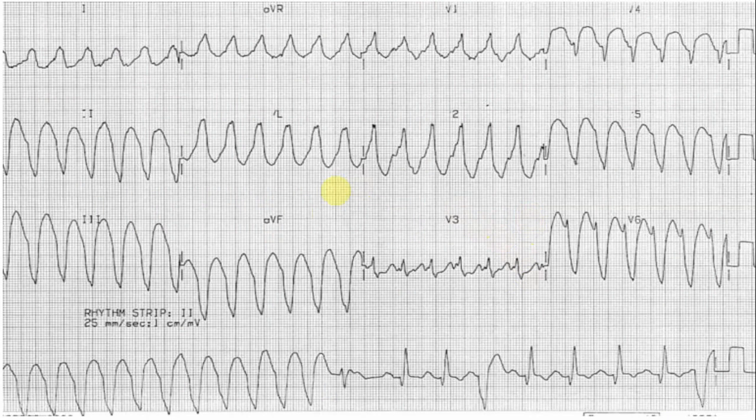Right, so let's have a look at another ECG. So this is another 12 lead ECG. We have got lead 1, 2, 3, aVR, aVL, aVF, V1 to V6, and also you have got a rhythm strip. So Becky is going to read this ECG for us and explain to us what are the different findings that we have, and she will also conclude the interpretation of the ECG and what are the steps we need to do for the management of this patient. Thank you, Becky.